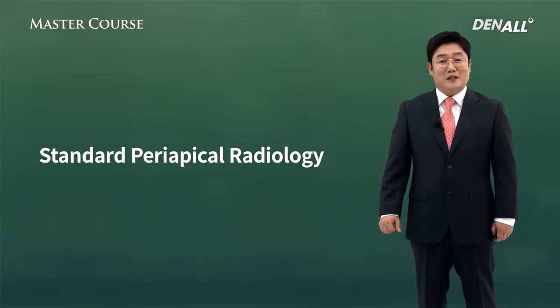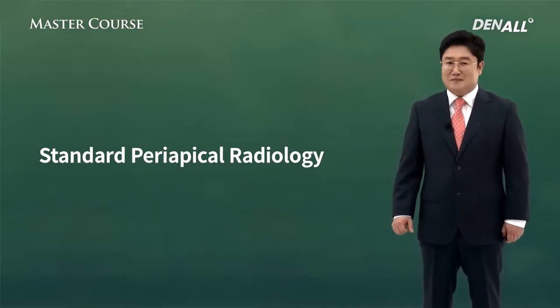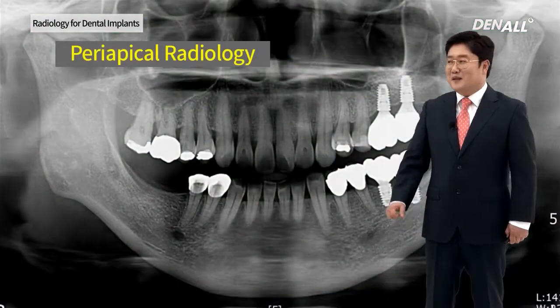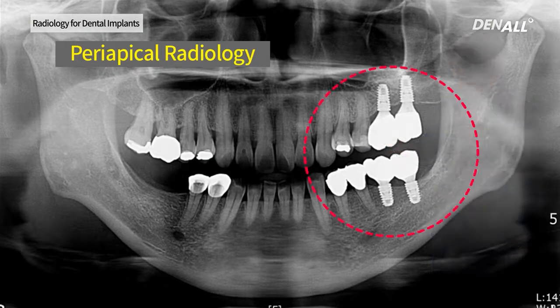Lastly, standard radiology or standard periapical radiology. Panorama X-ray picture. At the upper and lower left posterior areas, implants were placed.